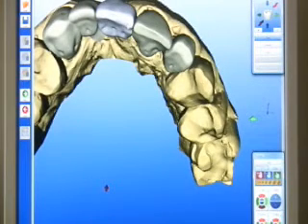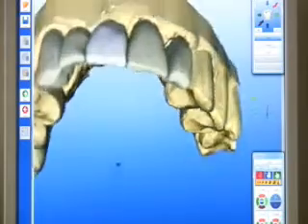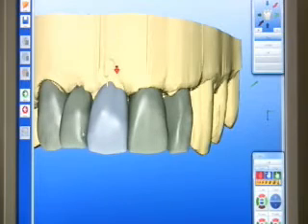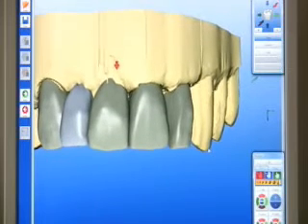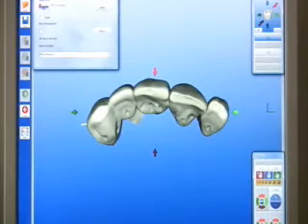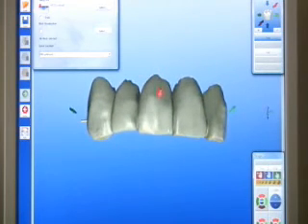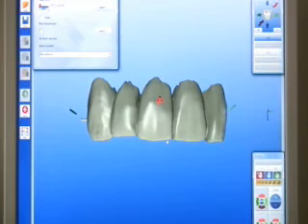We look around at different angles, make sure that the incisal edges are lined up properly, and check whether teeth are rotated. When you're dealing with a set span like this, you have to evaluate not only if the teeth work with one another, but if they fit into the space in a pleasing manner. With the way the software is right now, database is the only method that can be used for fabricating the provisional restorations, multi-unit provisional restorations. The overlay gives us the reference marks in order to get a better final product for the provisional.